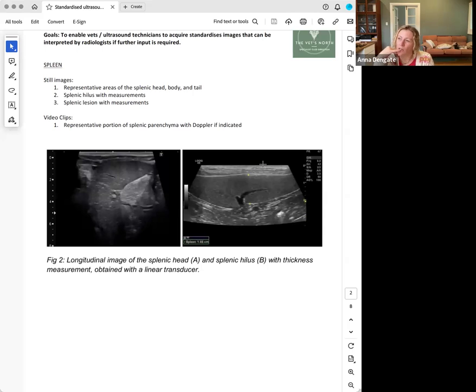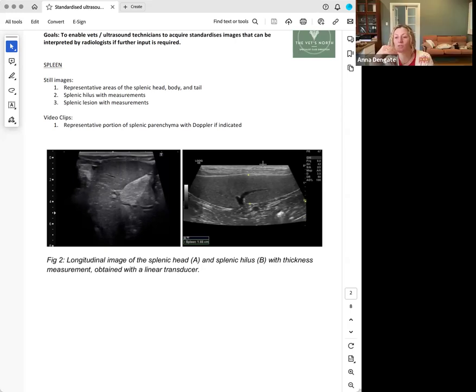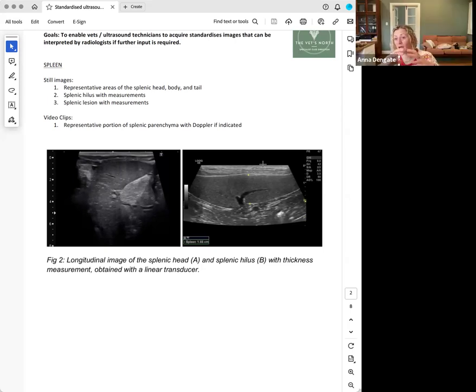Yeah. Sort of, except nodular regeneration causes some of the biggest splenic masses I've ever seen, because they're at risk of causing rupture, hemoabdomen, and then significant mortality and morbidity to the patient. Yes. Even if it's benign, if you've got distortion of the capsule of the spleen, then you know that things are stretched in there and they're more likely to rupture. So whether it's benign or malignant, that's a marker of risk. And that's one of the things that makes me go, okay, I think we should probably take that spleen out unless there's a contraindication for that surgery.